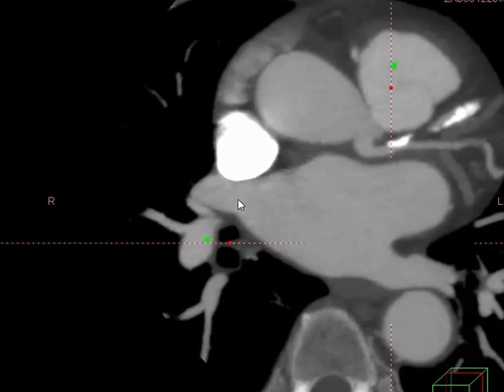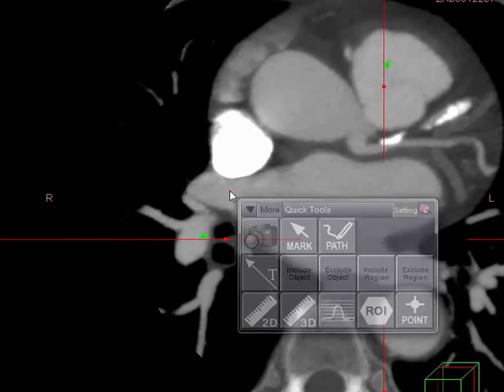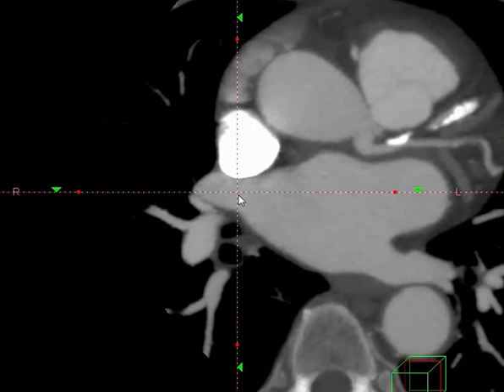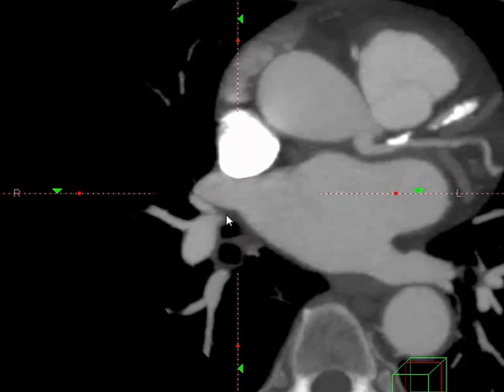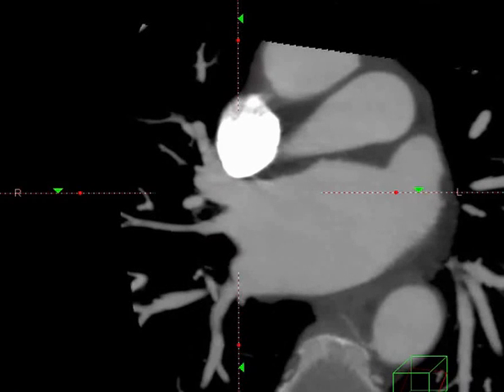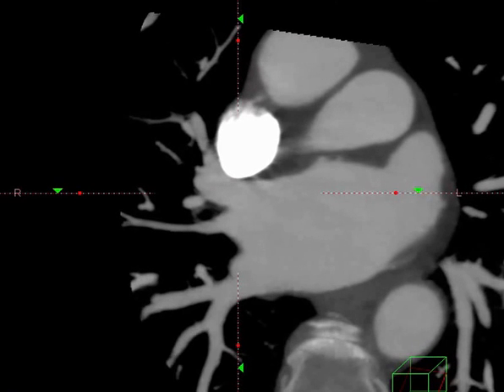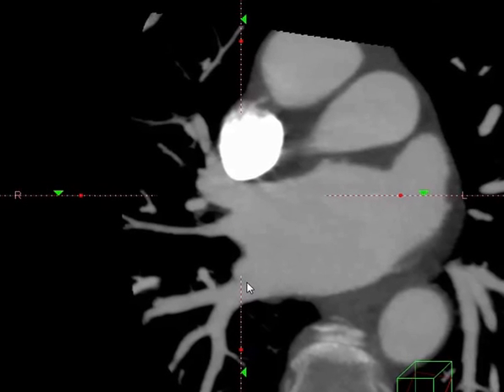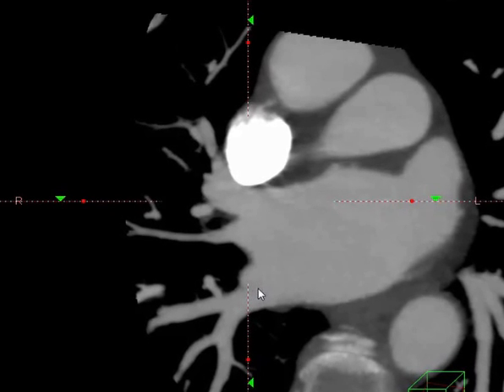So the right superior pulmonary vein is right here. So let's get that identified. If we do the same thing, we kind of rotate 90 degrees posteriorly, we can actually see the pulmonary veins on the right side come out reasonably well. So there is a right superior anterior and now also a small right middle pulmonary vein, as well as a right posterior inferior pulmonary vein, and you can make measurements of these to get nominal entrance diameters.